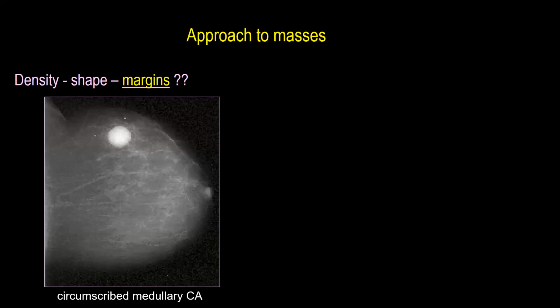Look, we have seen papillary, we have seen mucinous, and we have seen medullary, the three, and we have seen malignant phylloides. Just remaining from M, what remains? The metastasis, high grade. So this is one of the circumscribed malignant lesions.